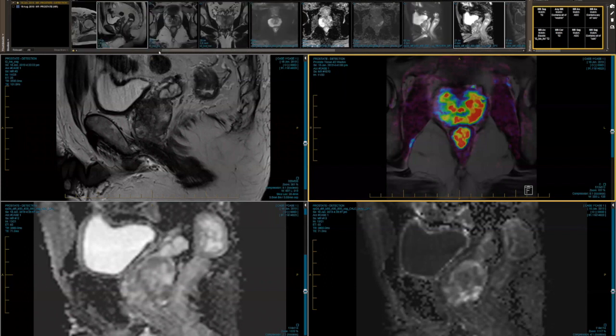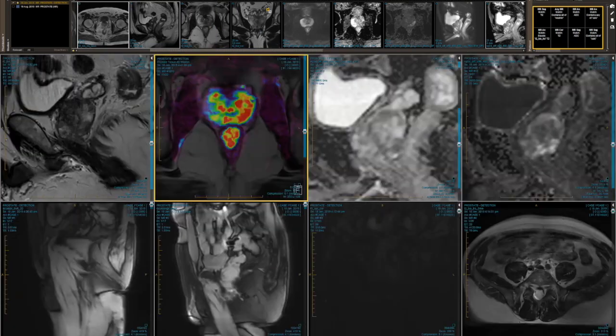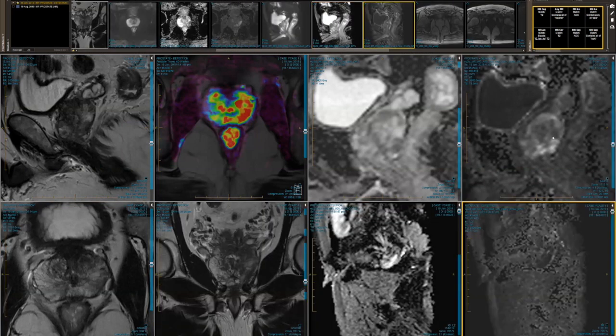Thank you. So we acquire them reasonably similarly, and I think most people we've looked at scans across the world now, thanks to Veeru and the PRIME study. Most people acquire their T2 pretty similarly, and in 3 planes, and usually the T2 is done really well, and these are really high quality T2 images. We can see all of the structures that we need to see.